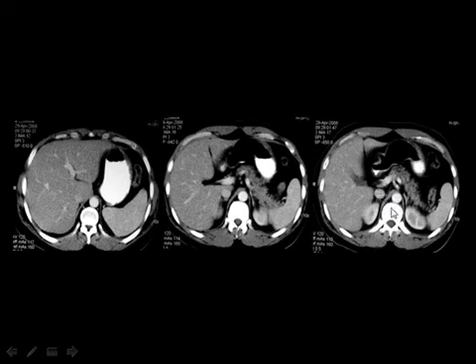This is the left kidney, this is the right kidney, this is the aorta, and this is the IVC. And you can see that the aorta is surrounded by 2 structures which represent the diaphragmatic crura. This is the left crus, and this is the right crus of the diaphragm, and this is the diaphragmatic hiatus where the aorta passes into the abdomen.